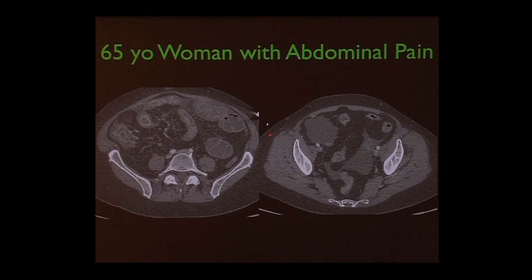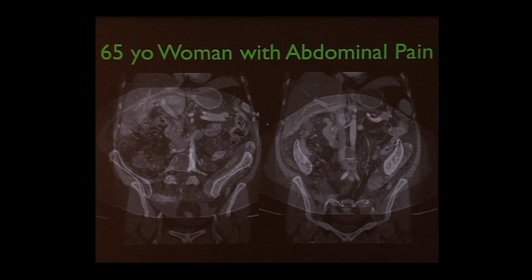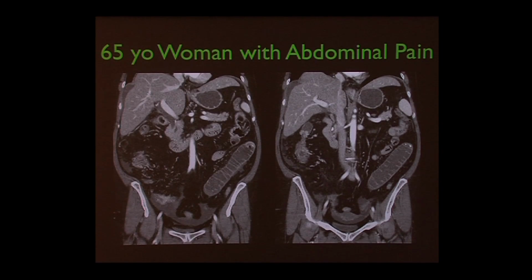Any idea? And then she has some free fluid, just fluid that's not supposed to be there, in her pelvis and elsewhere in her abdomen. So she has a lot of inflammation of something. Well, I've already told you what it is. She has inflammation of the bowel. So she has inflammatory bowel disease. It turns out she has Crohn's disease. So she has 2 reasons to have severe pain. And this was an active process. So she had an active, very inflamed GI tract at the time of this exam, as well as having that stone. And then we can repackage it, as I mentioned, in another projection.